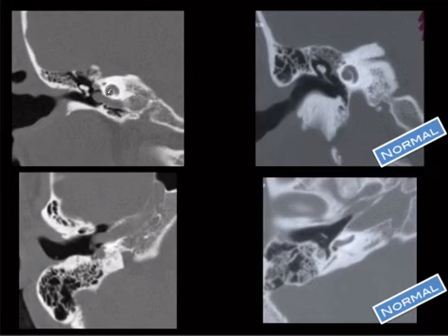And what we're seeing is sort of this soft tissue thing here, right? And that's not there over here. So the trick is that our soft tissue finding is, well, wait for a second. Let's go to the next question.